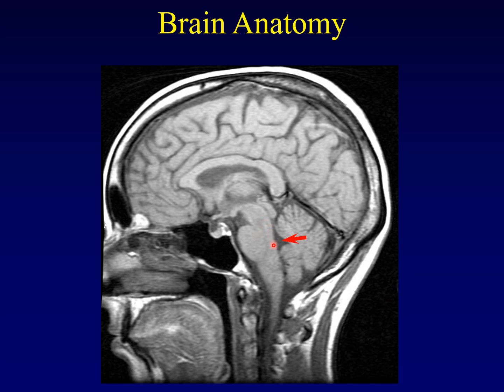So what's this triangle right there? It's that triangle of darker material. Well, this area right here between the pons and the cerebellum is the fourth ventricle. Now you're thinking, I thought the fourth ventricle looked sort of oval. The fourth ventricle looks oval when you cut it transversely, but it's got this complex three-dimensional shape, and so it's a triangle when you cut it in sagittal plane.